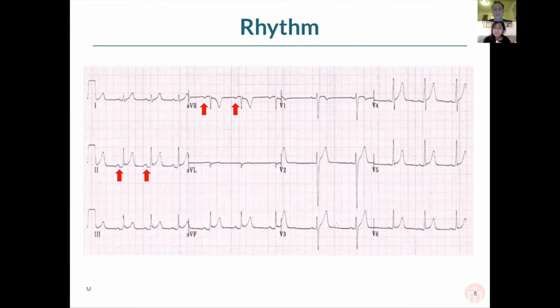And what sinus rhythm means is that it's coming from the SA node, right? That's what that means. The SA node is dictating where all of the depolarization happens and when the QRS complex depolarizes as well. And so that is P before every QRS, QRS after every P. And the other thing that is important in that is looking for a T wave after every QRS as well, because again, you need to see that repolarization occur in addition.